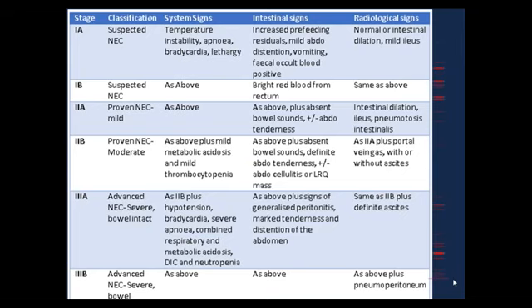Again, if you apply Bell's classification or staging, this infant initially, as per the clinical impression and the X-ray, was only consistent with stage 1A. But after applying the ultrasound, the impression totally changed to stage 3A, and after perforation became 3B, which is the bottom of the classification.